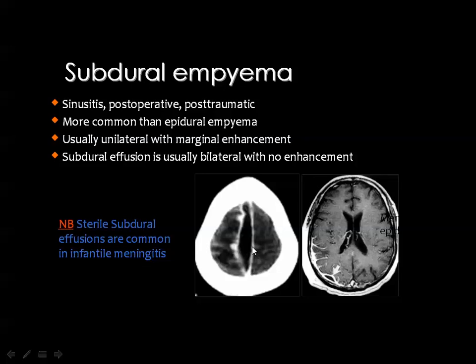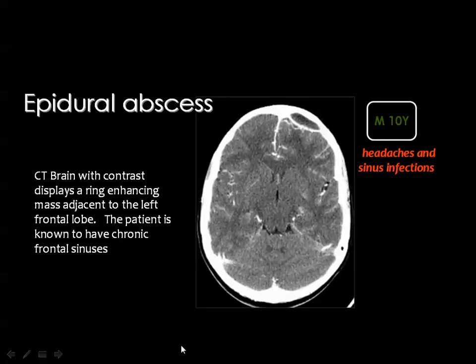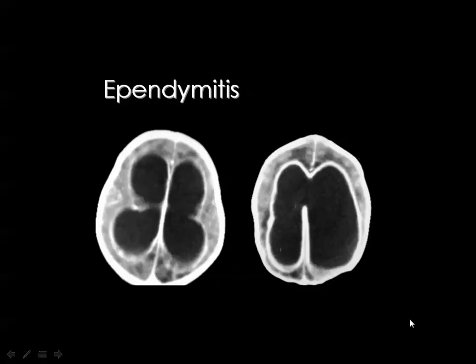Then you remember when I said that subdural hemorrhage can occur within the interhemispheric fissure or along the tentorial leaflets because there is no epidural space here. Also, pus can accumulate, and we can see enhancement of the margin, and this is diagnostic of subdural empyema. And this is an epidural abscess or epidural empyema. In a patient with meningitis, you see little meningeal enhancement, and you see the marginal enhancement of the collection.